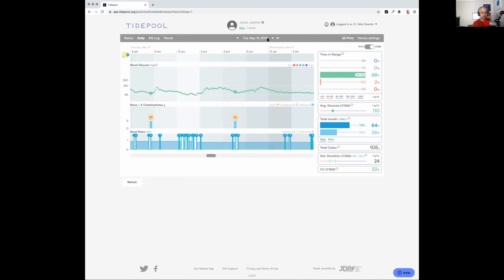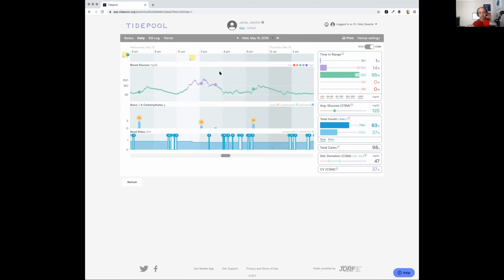Lastly, the one thing I want to highlight here, and this is something we're going to focus on tomorrow, are the notes. Within Tidepool, we have a concept of notes. This is how you can add context to your diabetes data. This can be documenting dog walks, site changes, sensor changes, menstrual cycles, specifically what you ate for breakfast, your exercise routines. Anything that adds context to your diabetes data is something that I would recommend making a note for.